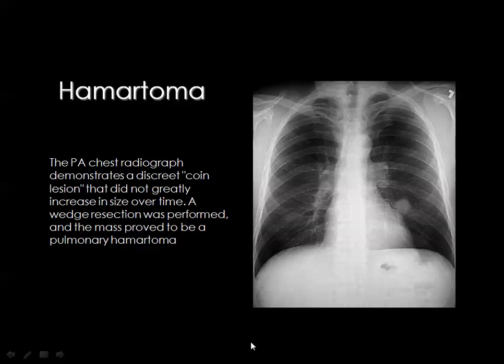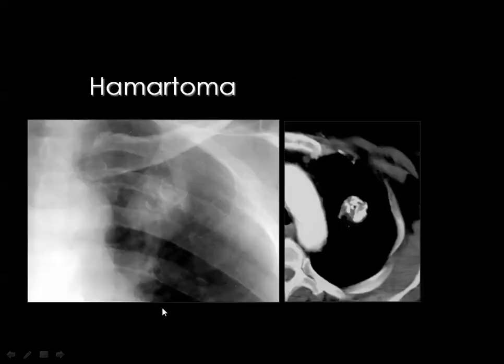Then the hamartoma is a benign lesion made of normal cells arranged in abnormal location. And the hamartoma being asymptomatic, it is usually seen in the adult patients and less frequently seen in the pediatric cases. And this is an example of a pulmonary nodule which is located in the left lung base. But if you have the chance to see calcium inside the nodule, then you are in the differential diagnosis of the tuberculous lesion, the tuberculoma, or the hamartoma.